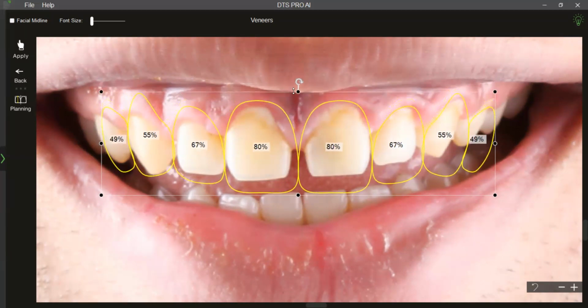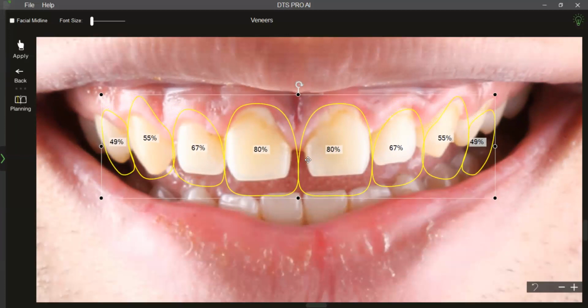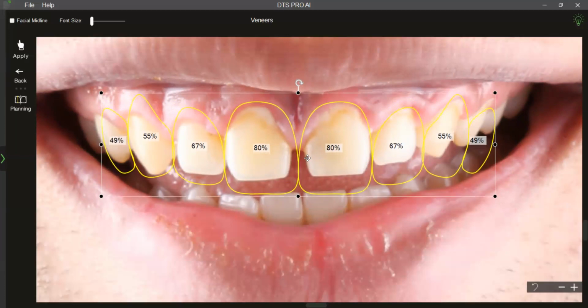So this much is more than sufficient for me, even if at this stage I am not looking at doing a complete detailed planning. Again, there would be a separate discussion on the complete digital smile design protocol. But for now, the basic planning of achieving an 80% width-height ratio tells me where the position of the teeth would be if I am striving to achieve the ideal proportion of teeth.